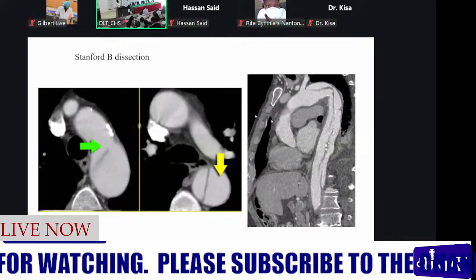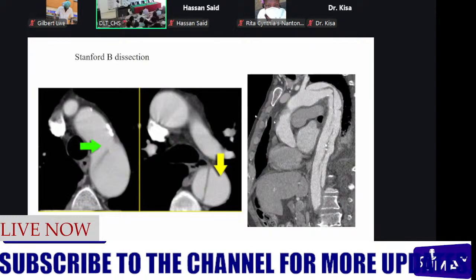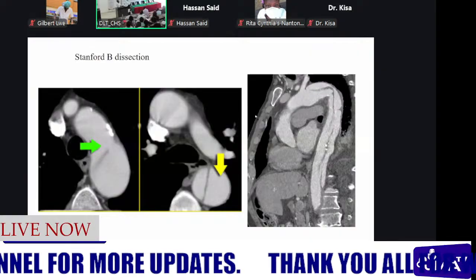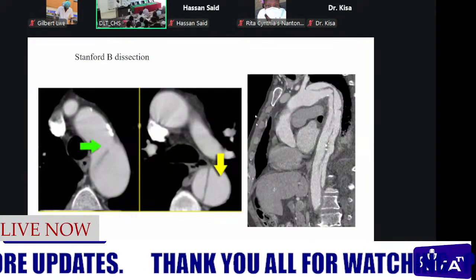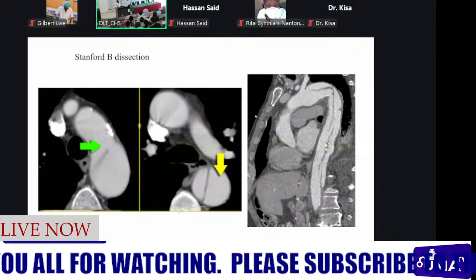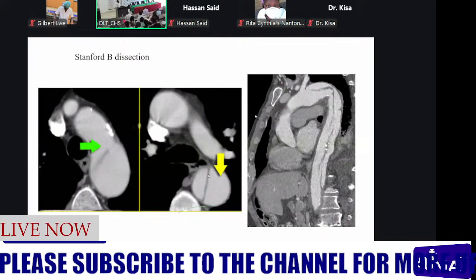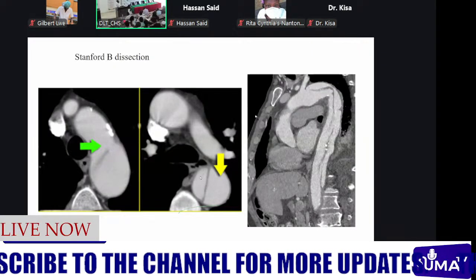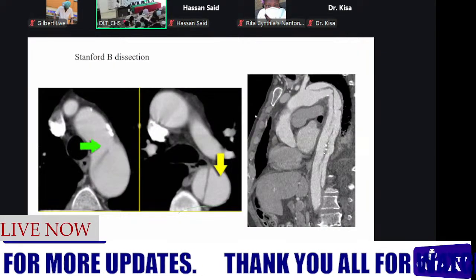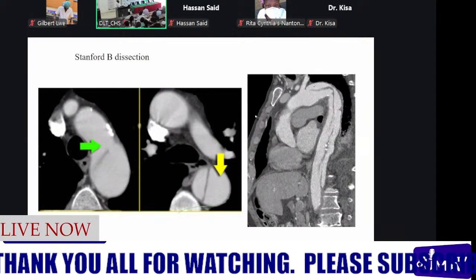The findings were consistent with a Stanford type A dissection. Then for Stanford type B, we said the dissection is confined to the portion of the aorta which is distal to the origin of the left subclavian artery. So at this point, we are able to appreciate the entry point here. This is our true lumen, then the false lumen, and we have this entry point. And at this point, we are able to clearly visualize the intimal flap separating the true lumen medially from the false lumen laterally. And also here in this sagittal view, we are able to still appreciate our true lumen, the intimal flap, and the false lumen.